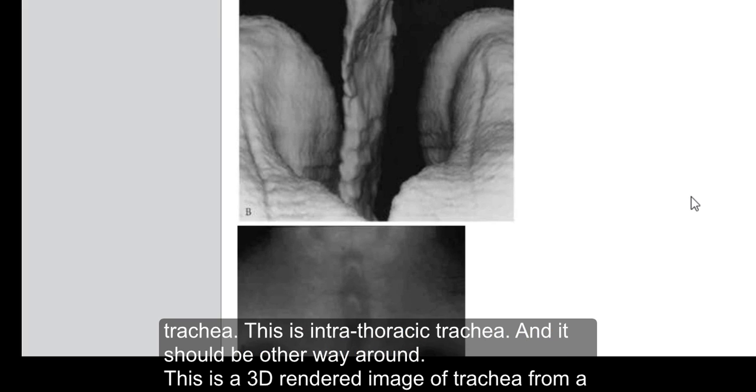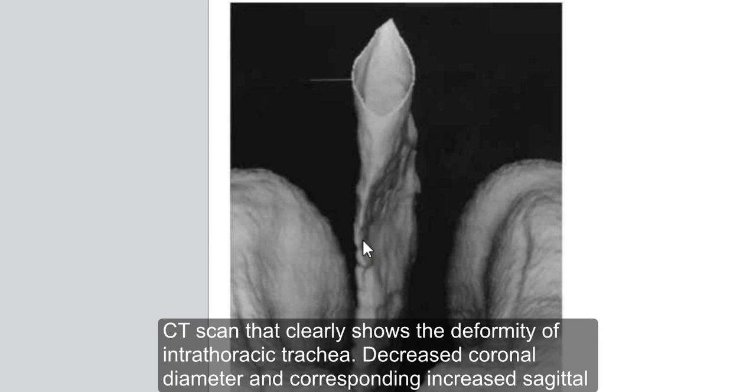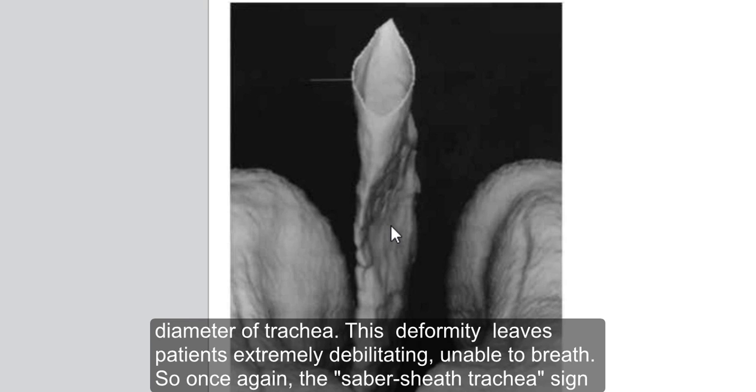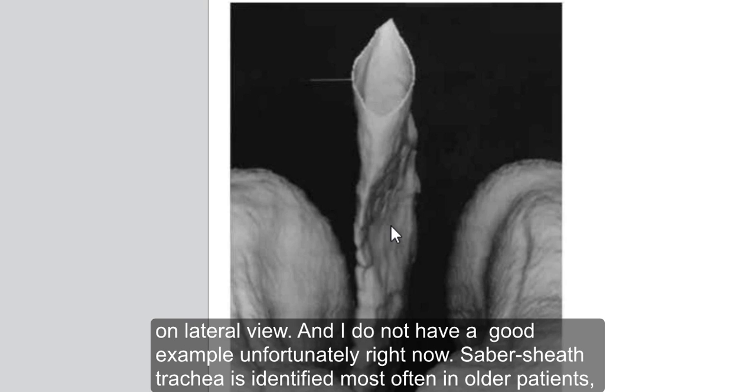This is a 3D rendered image of the trachea from a CT scan that clearly shows the deformity of the intrathoracic trachea, decreased coronal diameter, and corresponding increased sagittal diameter of the trachea. This deformity leaves patients extremely debilitated, unable to breathe. And so once again, the Sabre Sheath Trachea sign refers to marked coronal narrowing of the intrathoracic trachea on frontal views with corresponding sagittal widening mostly visible on lateral view. And I don't have a good example unfortunately right now.